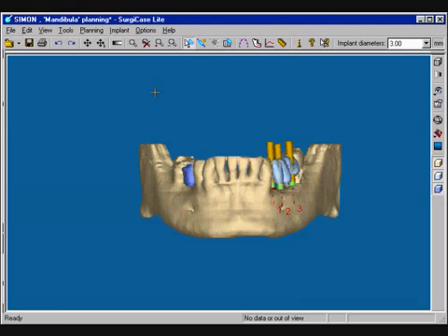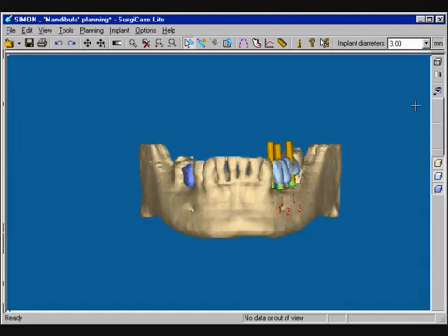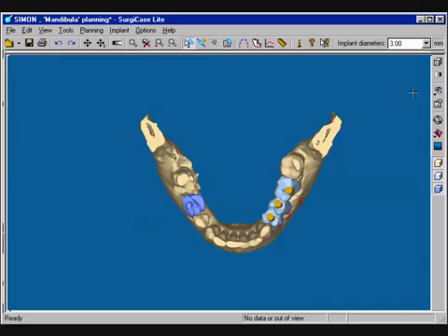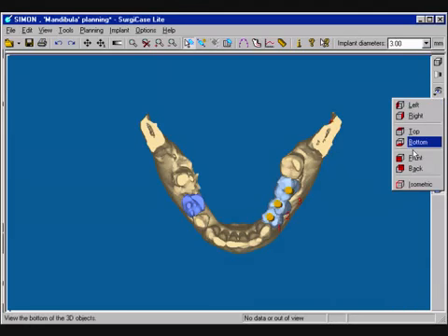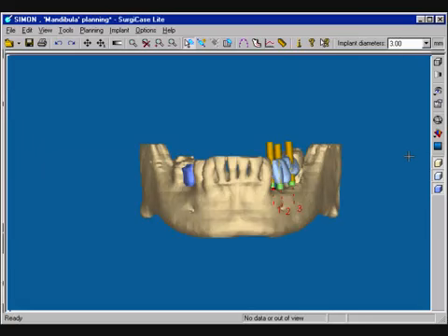Visualization options available. First of all, the 3D models are not static on your screen. By selecting the Select View button, you can see different predefined views in the menu. The examples are left, but further, you can also rotate the 3D interactively by selecting the Rotate button.